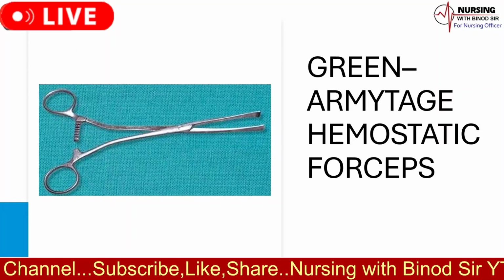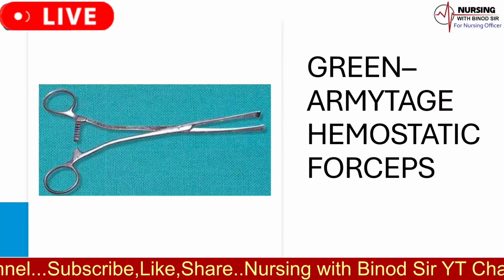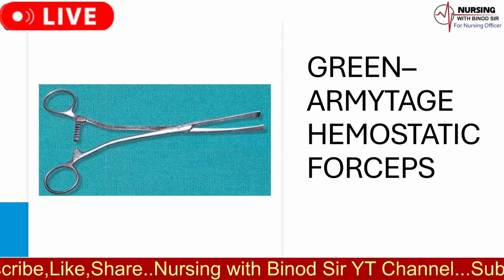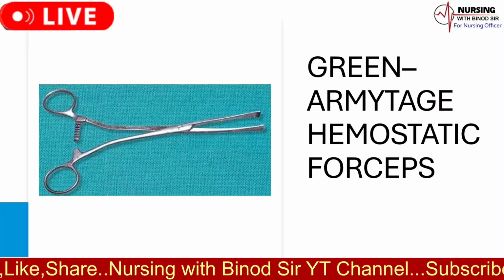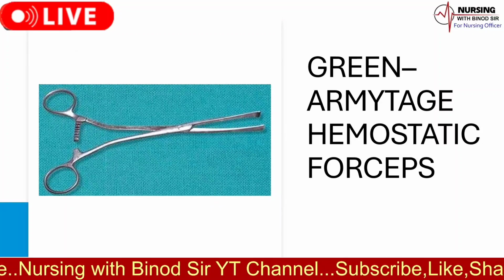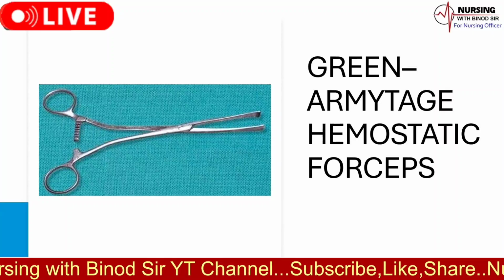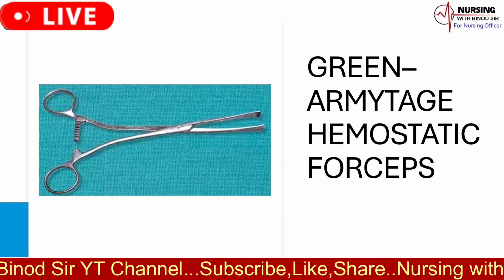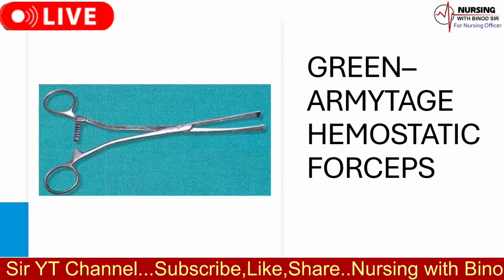They are invaluable in managing postpartum hemorrhage by providing effective and reliable clamping of uterine arteries. 6. Versatile use in other surgeries. Despite being primarily designed for obstetrics, these forceps are also adaptable for vascular surgeries and other medical fields where hemostasis is critical.